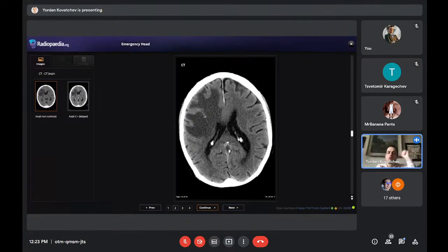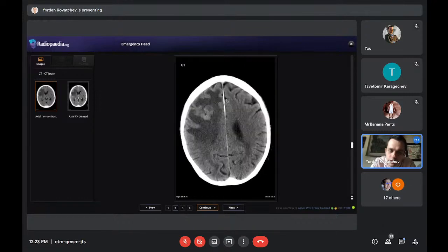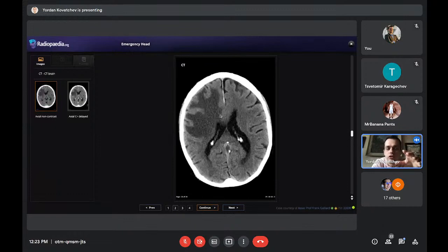One more thing: it goes through vascular territories. This is the territory of the anterior cerebral artery, and this here is the territory of the MCA, the middle cerebral artery. All these changes don't care about territories. They just go. There is big edema. It doesn't care about any restrictions. It even crosses the midline. The midline is not shifted that much yet, maybe a few millimeters.